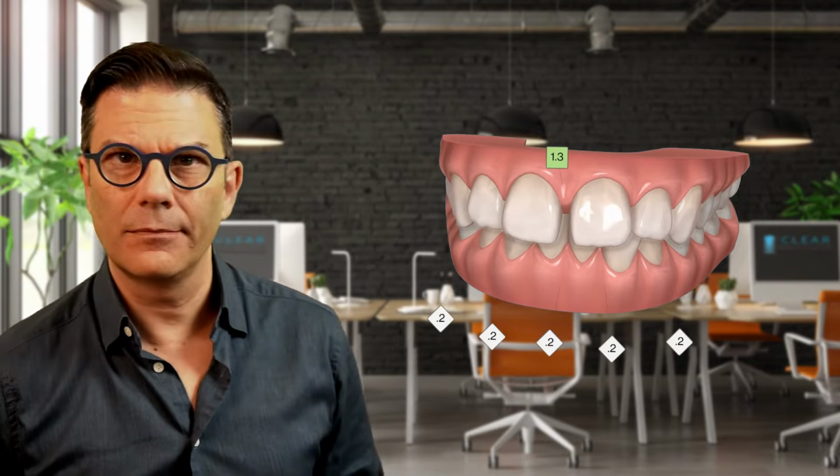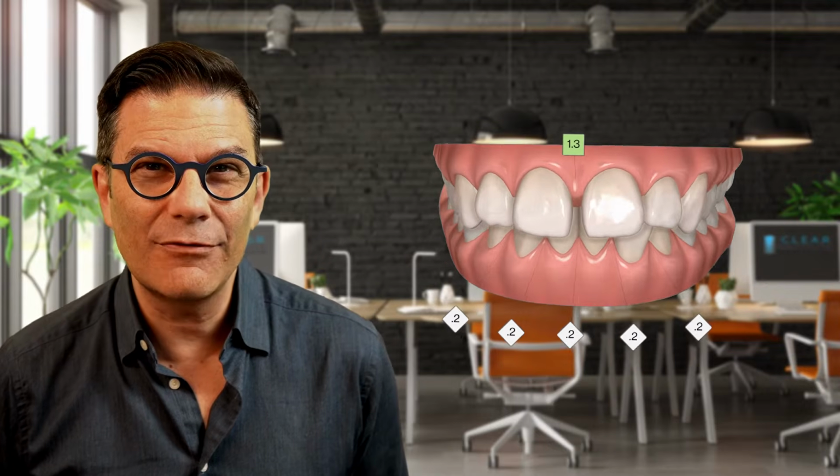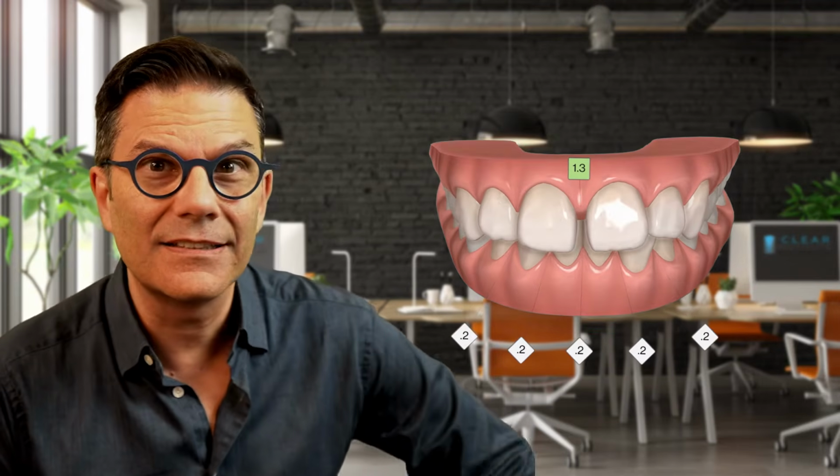Now I just received my case. And there's some IPR. Show your IPR. And it's 0.2 millimeters everywhere, but I want 0.1. Or maybe I want 0.6 or 0.7 or 0.8. Yes, I can be crazy.